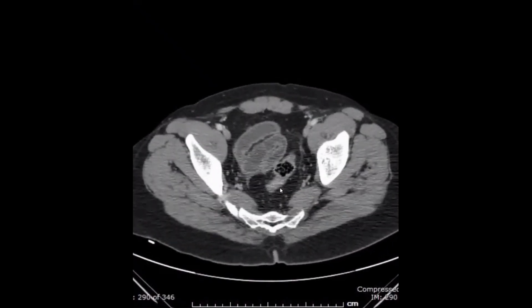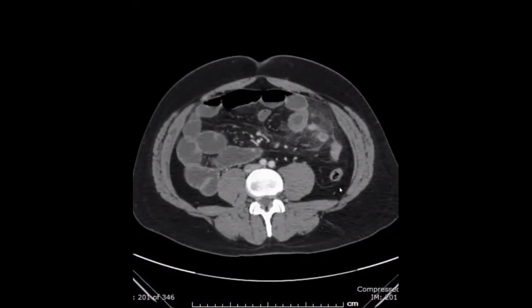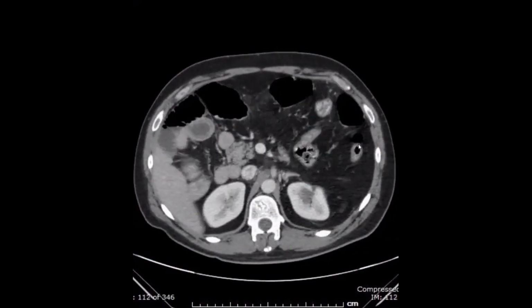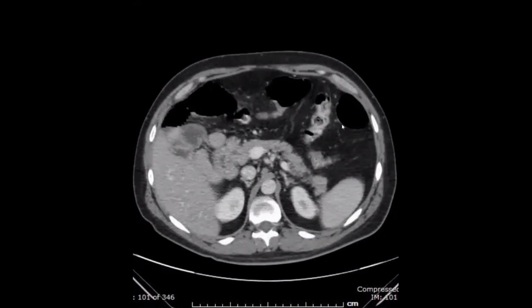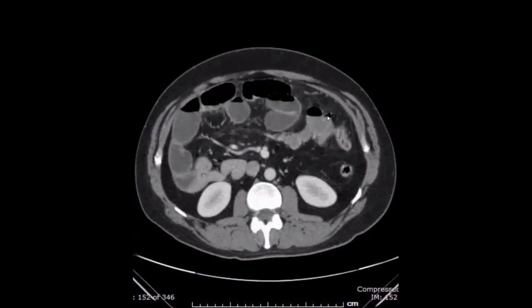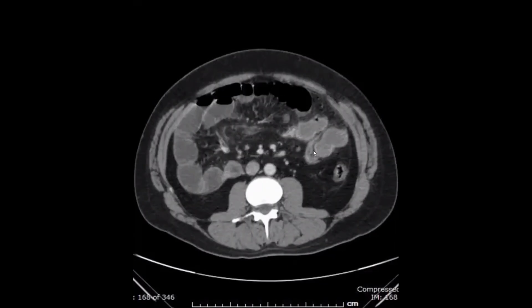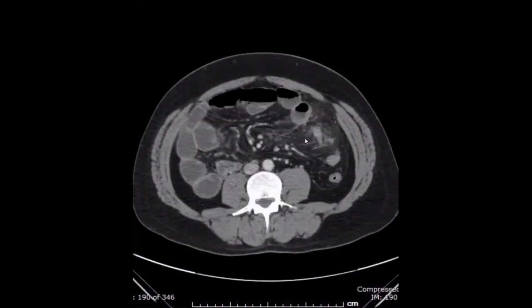Yeah, we have here the rectum, sigmoid colon, descending colon, and splenic flexure, and this is the transverse colon, and the transverse colon is going here, and this is the ascending colon. And what is this one? Cecum. Yeah, the cecum. And what is this?